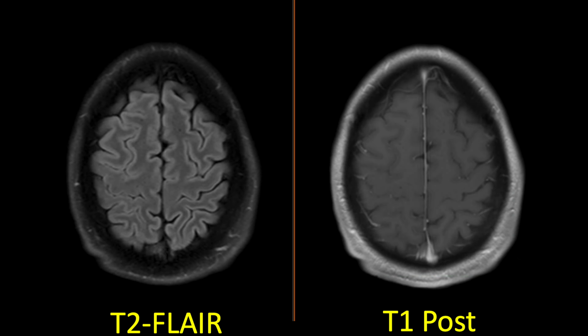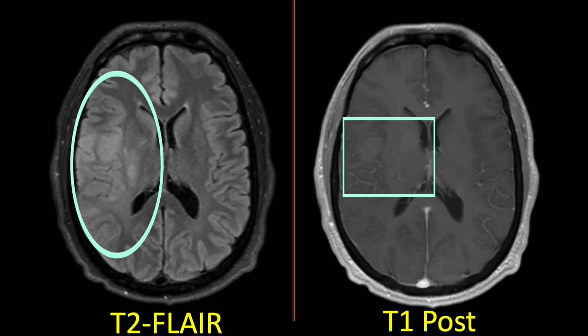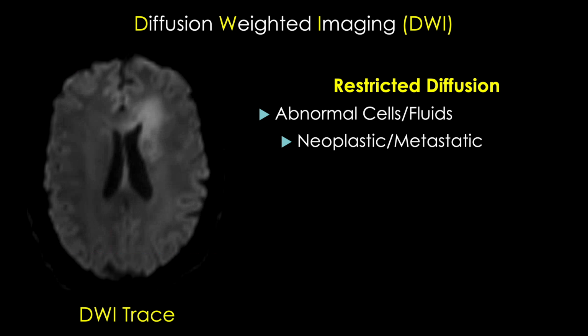You can see we have a lot of abnormal T2 signal on the FLAIR images and some subtle enhancement on the post-contrast images. This happens to be a glioblastoma, one of the many different ways it can look, so it's always good to remember this within the differential for a diffusion restricting mass. Lymphoma is not the only thing that can show restricted diffusion. Let's talk about some non-neoplastic sources of restricted diffusion.